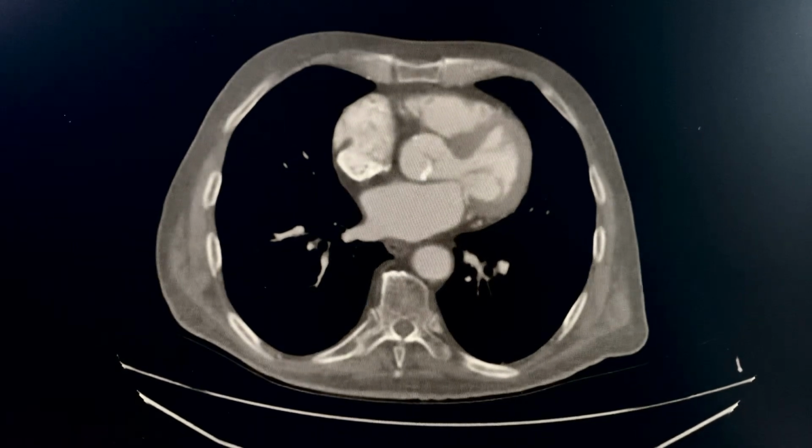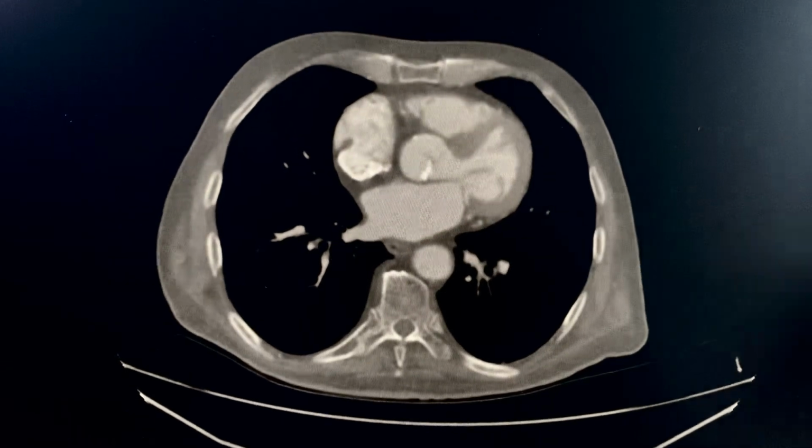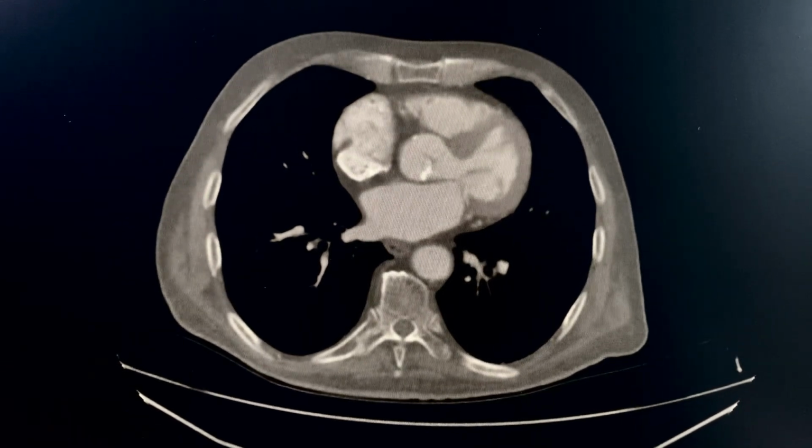Today I'm presenting a curious case of acute limb ischemia. This is an 86-year-old male that presented last night with clinical signs of acute limb ischemia on the left leg, left lower limb. So the patient presented with pulselessness, pallor, pain, coldness of the left limb, paralysis of the left foot and ankle, right?